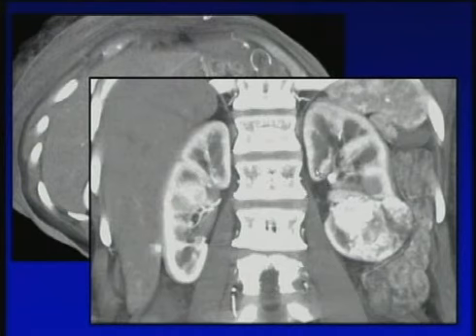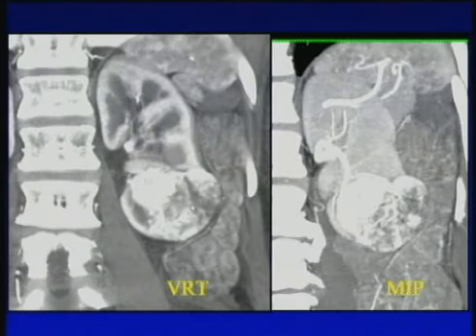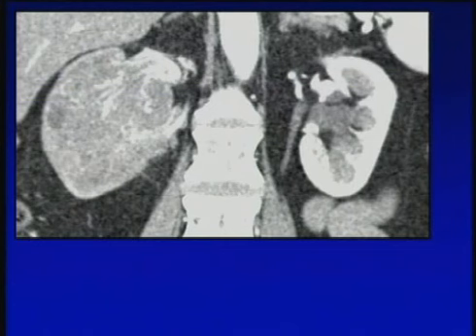But one of the other important things that cortical medullary phase imaging gives us is the ability to look at the vascularity, not just saying a lesion is hyper or hypovascular, but looking at neovascularity. And one of the important things, I think, as CT goes beyond 64 to dual energy, will be the ability to look at perfusion, look at neovascularity, and from that determine aggressiveness of tumors. And there's some articles now that have been published that basically say that you could determine how aggressive a tumor is based on its vascularity. And unless you do cortical medullary phase imaging and look for those areas of AV shunting, you're not going to be able to visualize it.